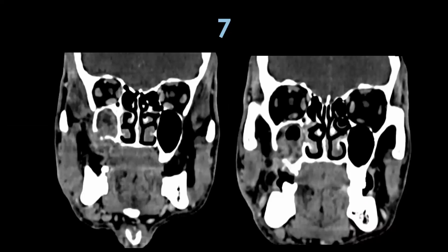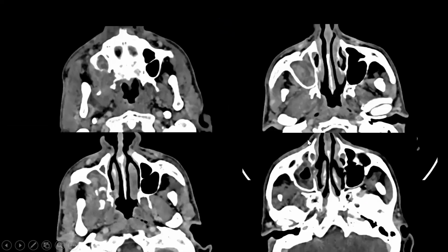So this is the last CT case. Again, upper alveolus region eroding the inferior wall of the maxillary sinus, going into the maxillary sinus. There's some enhancing soft tissue also in the nasal cavity. Posteriorly, retroantral fat is involved. These are the pterygoid plates. So we can see the normal pterygoid plates here. The lateral pterygoid plate is eroded here.